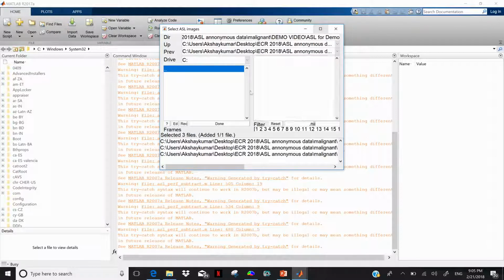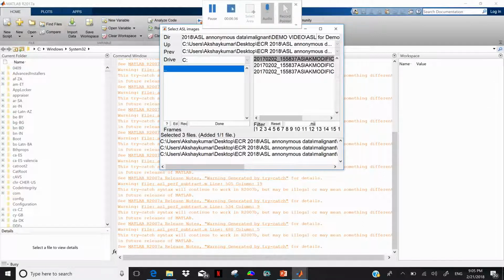So something is really wrong. This is not the file. This has only 3 files. Either I have, okay, this is really wrong. I need to stop it. Okay, pause it. Actually, I was going to pause it and tell you, but this is important. This is a troubleshooting step.